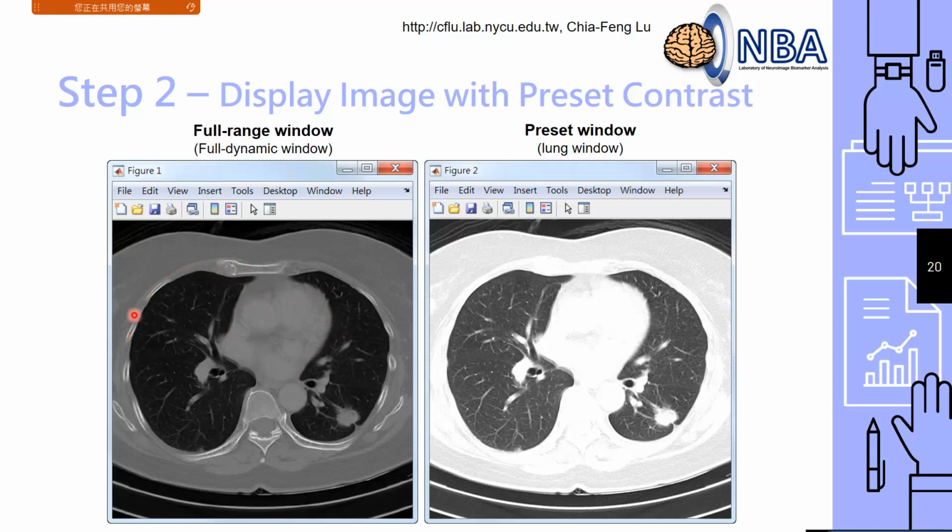And these two big things right here, this is the right lobe of the lung, okay? And this part is the left lobe of the lung, okay? Because this is the actual image, the left and right refer to what we know. So this part is the right side of the patient's body. This is the left side of the patient's body. Just remember this, okay?